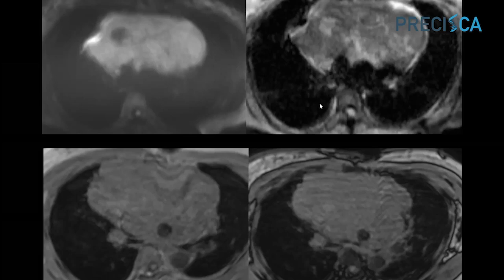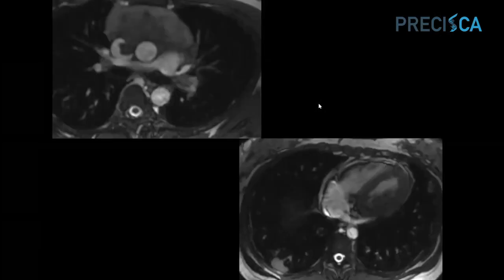Now, I will tell you that as part of a non-contrast MR, it's also useful to have sequences which are designed to look at the blood vessels. It's a balanced steady state image, and you can see blood vessels are nice and white. And so this is really useful. You can see there's the mass. Now let me draw your attention to the internal mammary arteries and veins, and you can see that this mass starts to wrap around those vessels.